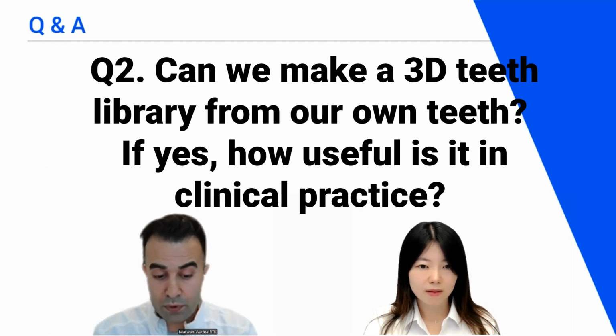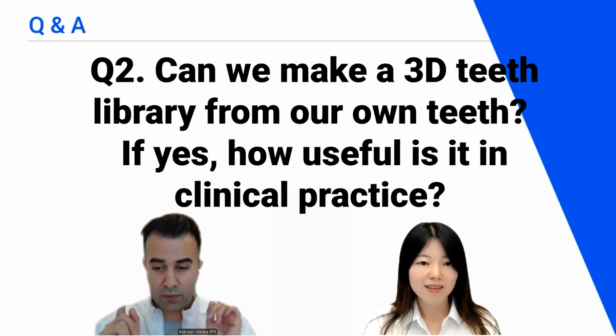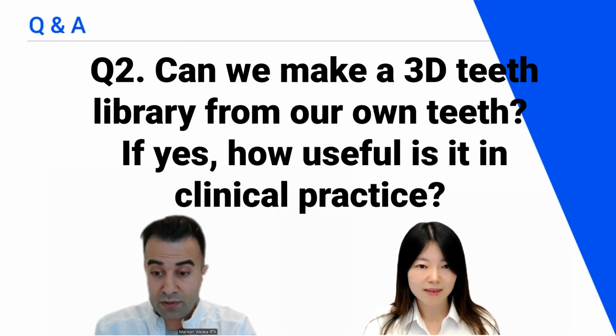And the beauty, the power of digital dentistry is symmetry. We understand left and right, we want them to be symmetrical to a certain degree, especially the canines and the premolars, while the centrals have to be 100% symmetrical. In the past, we would recommend even numbers of veneers for a patient, because copying every single corner from one tooth to the other by hand is quite hard. However, with copy and mirror paste, that becomes possible.